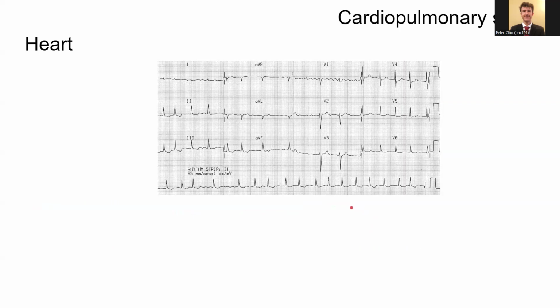Okay, so for these next couple of slides, I'm just going to have some EKGs. Maybe I'll have a vignette about the symptoms that the patient might be having. But in many cases, if you're presented with an EKG on a shelf or a Step 2 question, many times you might actually be able to get the right answer just by looking at the EKG. And then after you look at the EKG, you can say, okay, I think this is a differential diagnosis. And as you're reading through the vignette, you might be like, all right, these features that I'm seeing in the vignette are agreeing with what I'm thinking is going on based on the EKG.